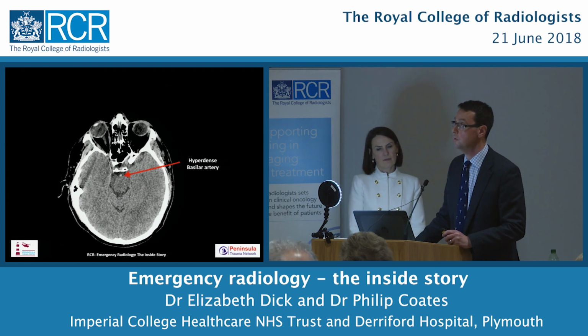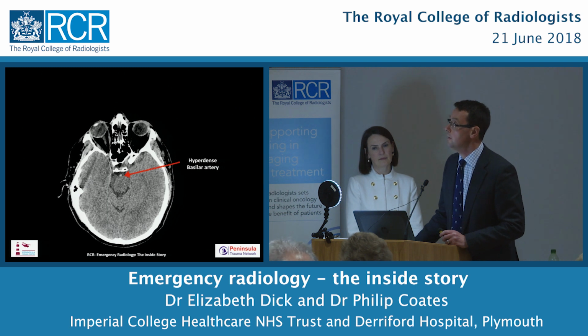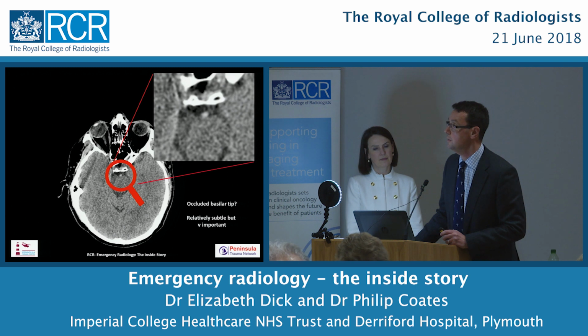This is a non-contrast CT of the head, so we haven't given dye. But he's going to get some dye in a minute to try and clarify what's happening with these vessels. So at this stage, the thought is, has he gotten occluded to a blocked basilar tip? It's subtle, but it's an important finding.